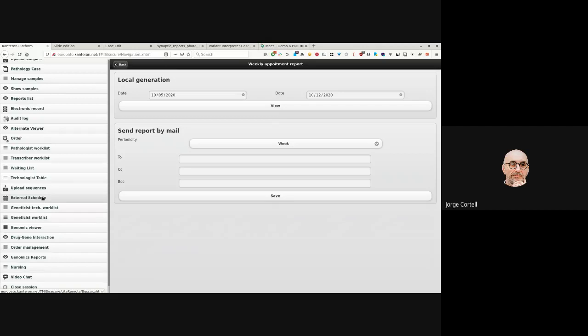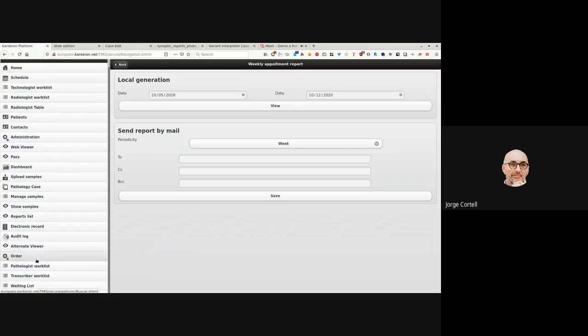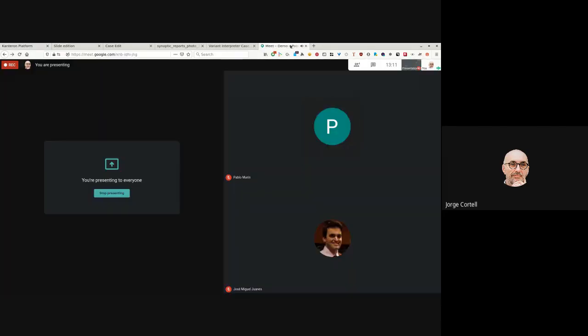So like I said, there are many other elements: orders, list of reports, external scheduling, uploading samples, managing the orders, the nursing data entry. But basically, this is an overview of our platform. So if you have any question, let me know.